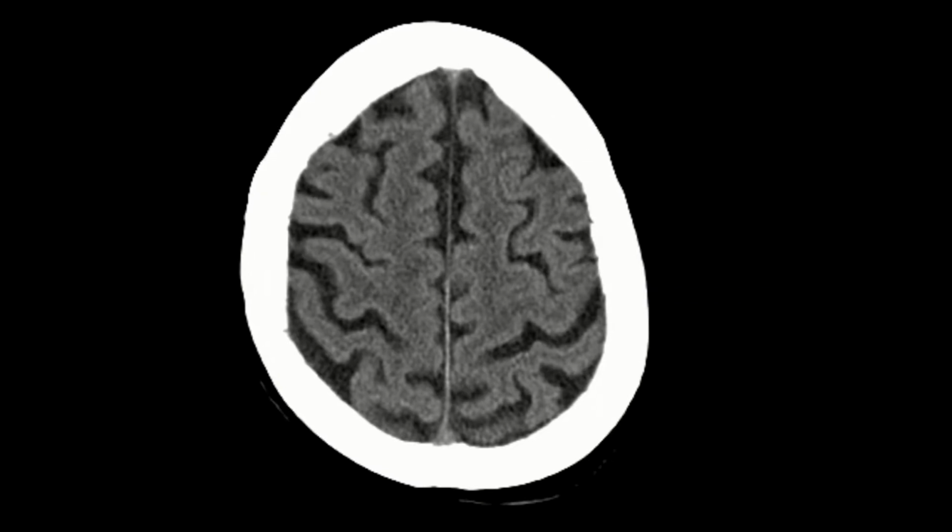Now, we will identify the central sulcus in this particular section, but before we go into that, I think what you would realize the moment you see this image is that the brain looks kind of funky. It looks smaller, it looks narrower, it looks thinner. So this is because this particular section is probably from an older adult, and as you age, your brain volume tends to reduce. And also, as a result of that, the ventricular system in the brain appears to become larger. So this is a normal degenerative process, so don't be alarmed by this.